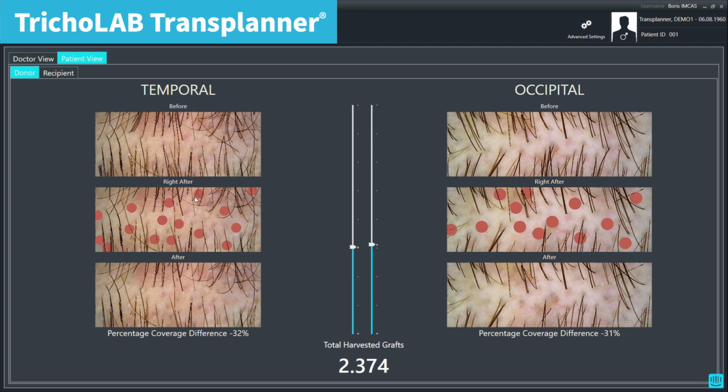You can also explain that actually all the hair that you harvest is gone. A lot of patients don't know this fact. So you can show this also nicely in this software. Plus you can educate and say this would be the perfect surgery in terms of safe surgery. Of course, if the patient is asking you what is the maximum number, you can even go to 50% and say, okay, maximum number would be roughly around, let's say, 4,000 grafts when you harvest 50%. More than 50% is actually almost a crime. So you can explain to the patient 50% is the maximum number of grafts, but let's focus only first on the surgery on 30% and see what we can do with 30%.